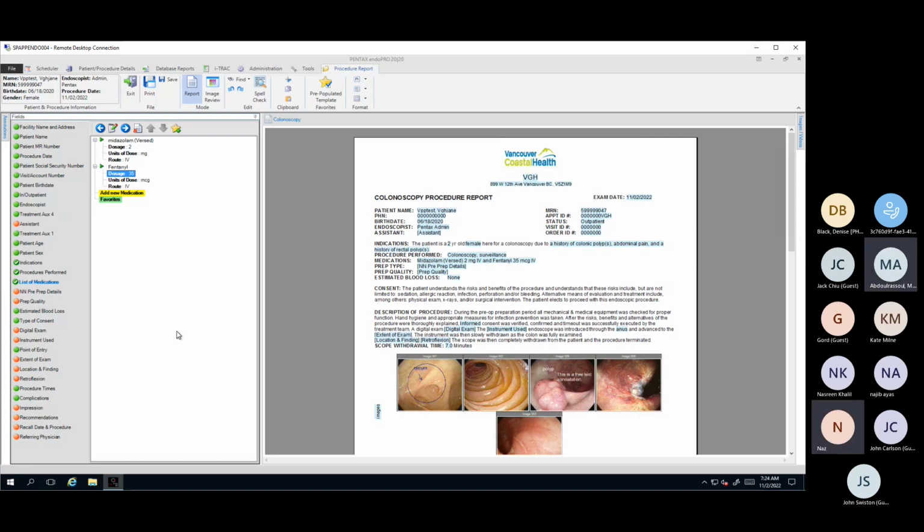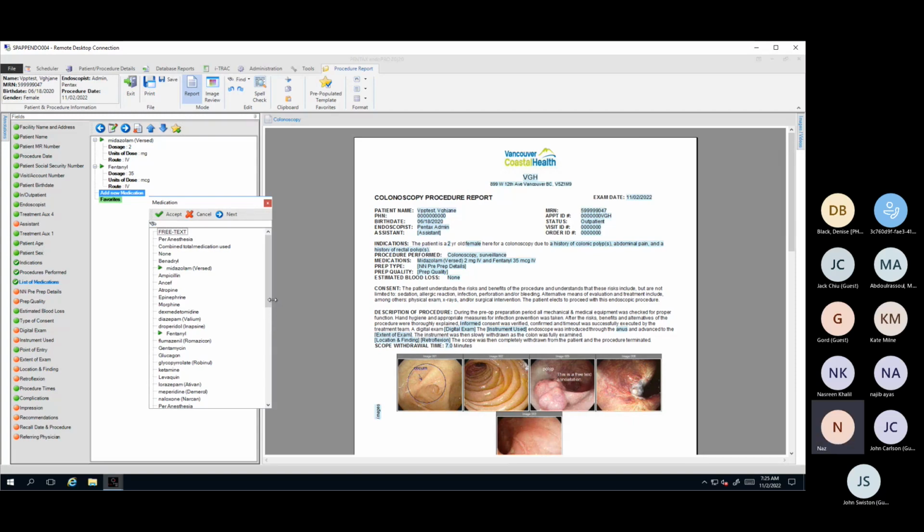Yeah, do you happen to also have Buscopan and diazepam? Because sometimes we use that, not very often, but Demerol, diazepam, and Buscopan. Good question. So the medications that you see here on this list is what we have at the moment.